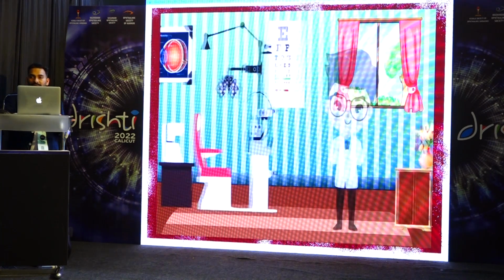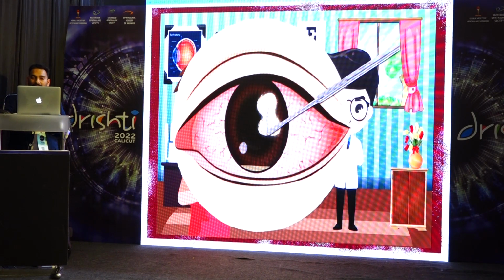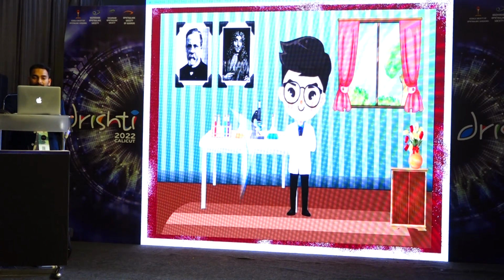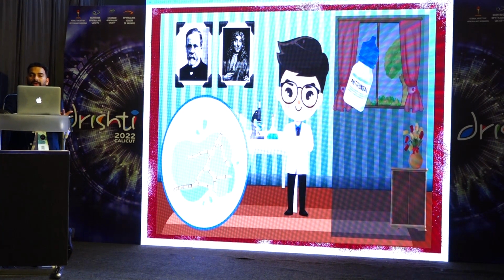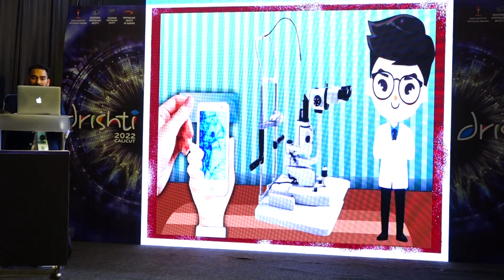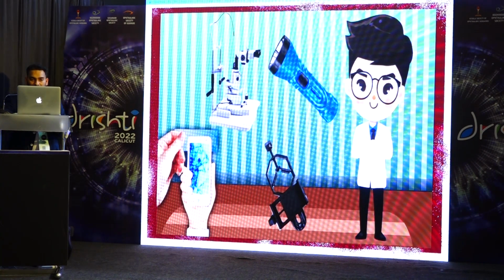So how the IOLSCOPE can be used on a slit lamp, like on our own slit lamp, to convert it into a point of care diagnostic device. As we know, we do scraping, and if we have a microbiology lab in our institute, it's well and good, because you can go and check. I don't know how many people actually have a microscope to check fungal hyphae in their own clinics, but I know for a fact that it is lacking in most clinics. So why not use the IOLSCOPE for the same? We need an adapter, a torch, and an IOLSCOPE, which we have already made.